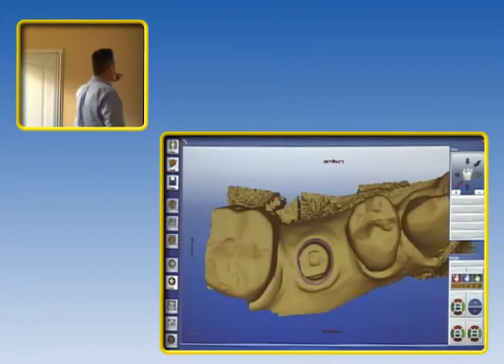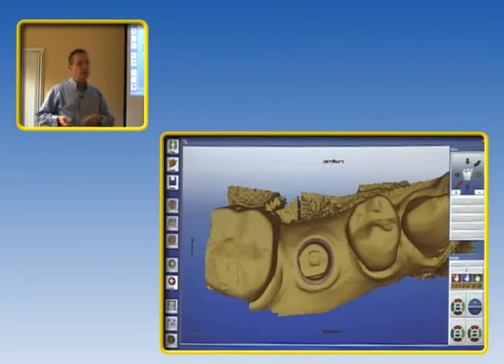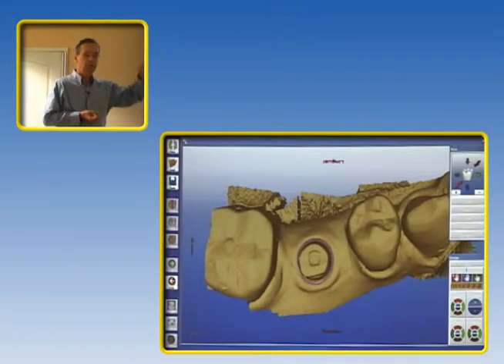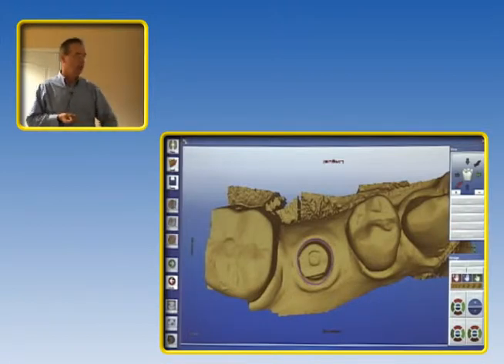When I arrow forward on this, it's going to open up a new patient folder. Okay, and I'll open up that new folder. I'll put in the doctor's name, the patient's name, and then I'm going to click on that margin. That margin's going to turn from pink to blue, and now it's back live again. Okay, and I'll start working that case forward.